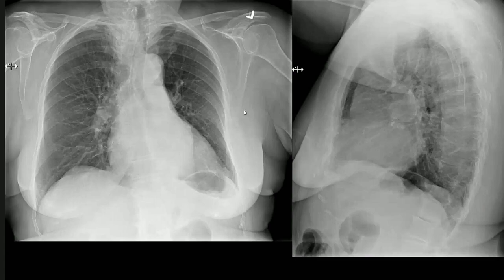The vertebral bodies are normal. Are you talking about this opacity? Yes, sir, which is also appreciable on the lateral X-ray. But this opacity, Dr. Pushpak, has some sort of dividing pattern, see? And it's a very common location for the right inferior pulmonary artery. I'm explaining the lateral chest radiograph.